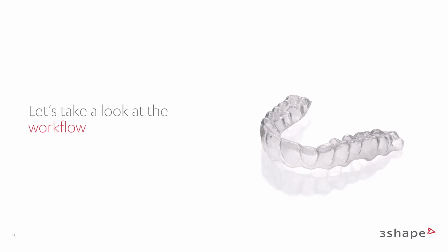A demo is worth 1,000 words, and we really look forward to showing you guys the new functionality. As promised, I'm going to take you through the entire workflow that is going to span both what's taking place on the clinic and also on the lab. So I'll sort of switch personalities from clinic to lab as we go through the workflow.